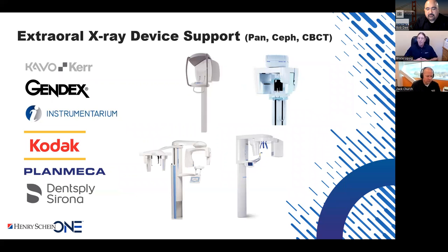Dr. Bob? Bruce, I explain this to my members in the group whenever somebody asks, but I want to stress that word integrate. They're not talking about a Twain driver. This is direct integration, which means the quality of your images is what it's supposed to look like when the manufacturer created it.